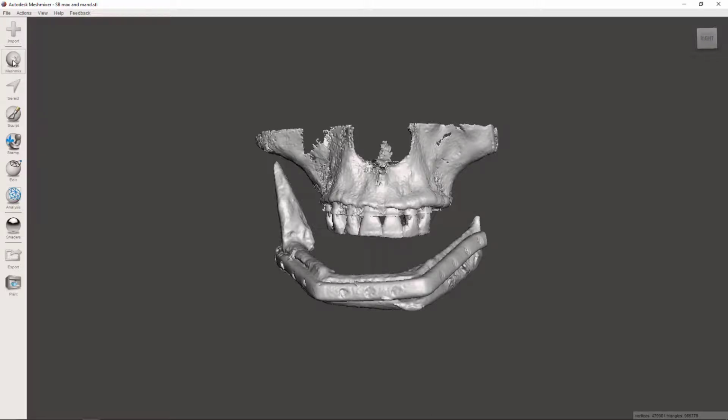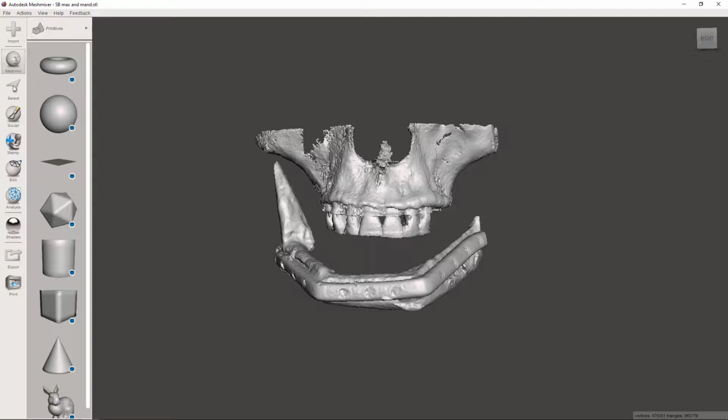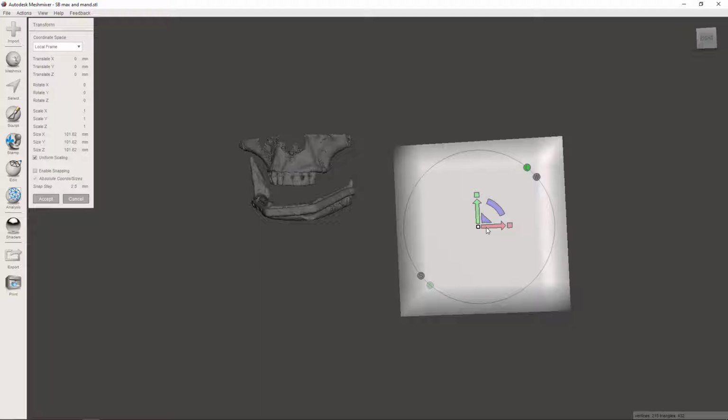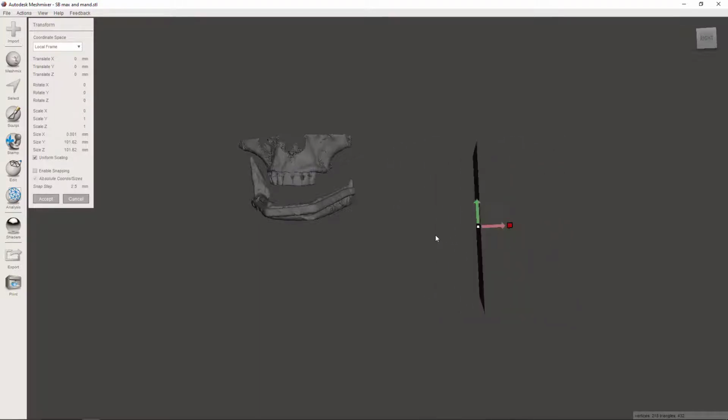So for starters, I don't even have to look at the pictures just yet. I'm just going to generate the plane. If you come up here to Mesh Mix, you can click on one of these cubes. These are under primitive shapes, and this is purely a cube. All right. Now I'll make this skinnier, and as I do that, you see it's changing dimensions here. I want to make this real thin, like 0.3 millimeters thick.